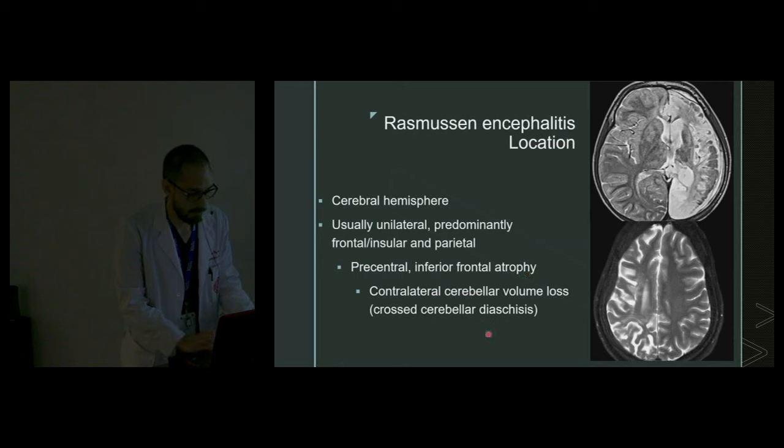It is rare that the cerebellum is affected, but we can see contralateral cerebellar volume loss, as we were seeing in the case that I presented.